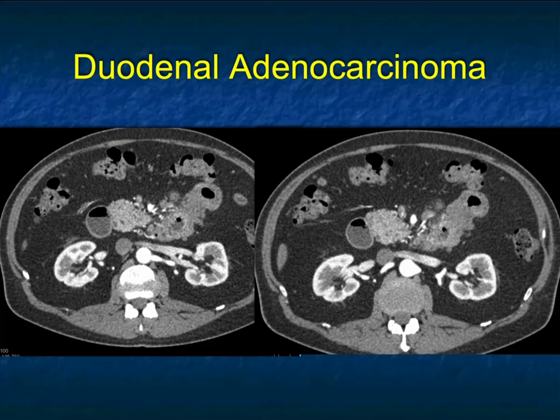Another case, here we see a dilated duodenum, and then the duodenum is infiltrated, it's thickened. It's not Crohn's disease. This is more significant thickening. It's bulkier.